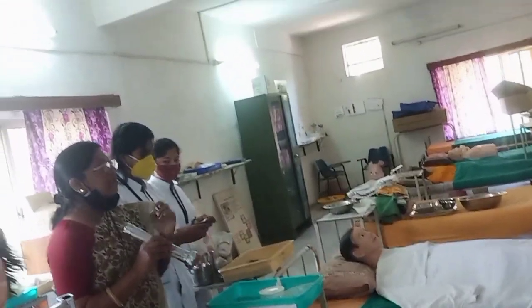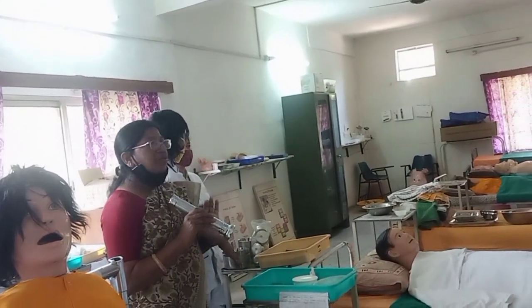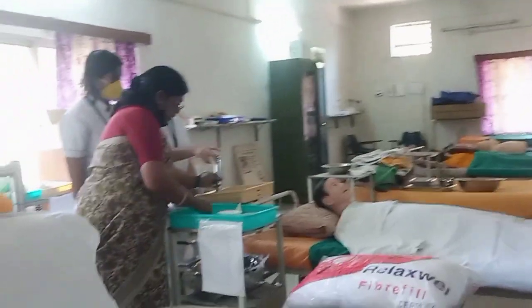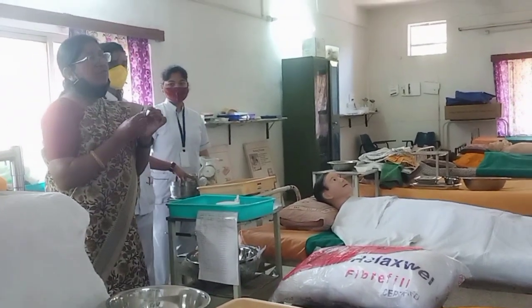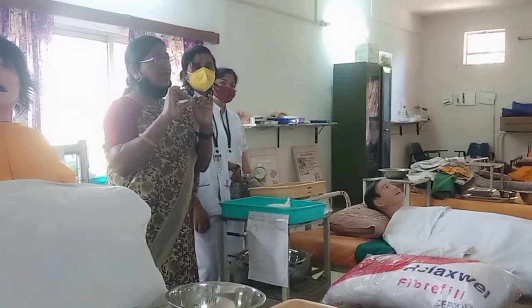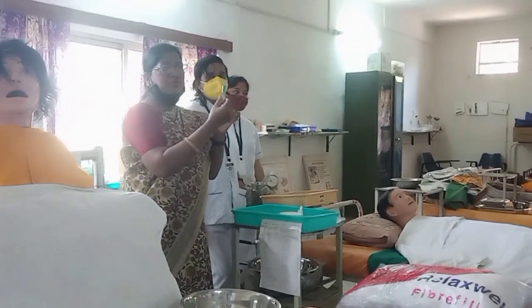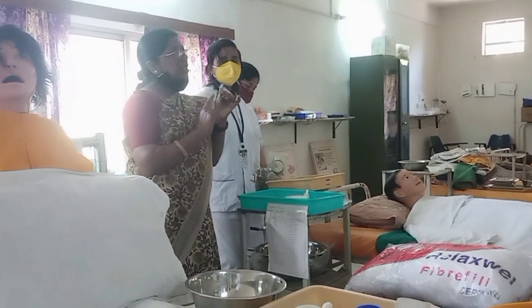If the patient is having any problem in the teeth, if there is any pain, you can use the torch at the time of physical exam. And this, at the time of physical exam, you have to keep in your pocket also, for taking measurement of abdominal girth. We call it abdominal girth. पेशेंट के जो स्टोमक की हाइट देखने के लिए भी ये ओपीडी में बहुत यूजफुल है. ओके, एंड पेशेंट का हाइट भी मेजर आप कर सकते हैं.